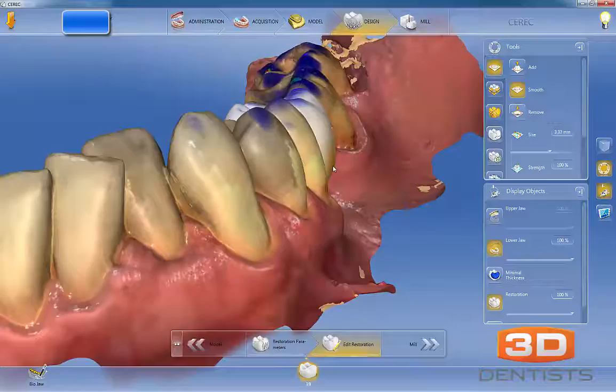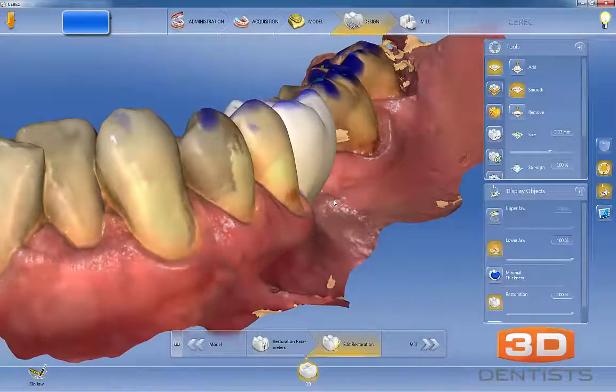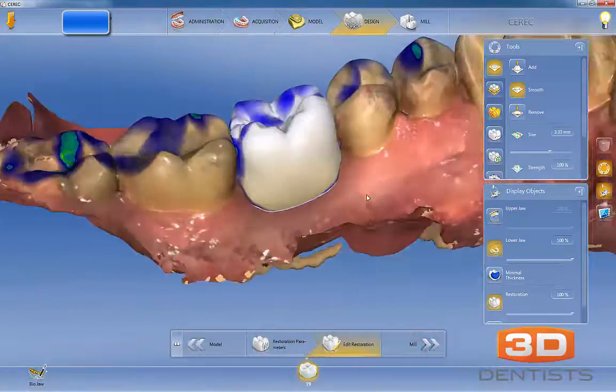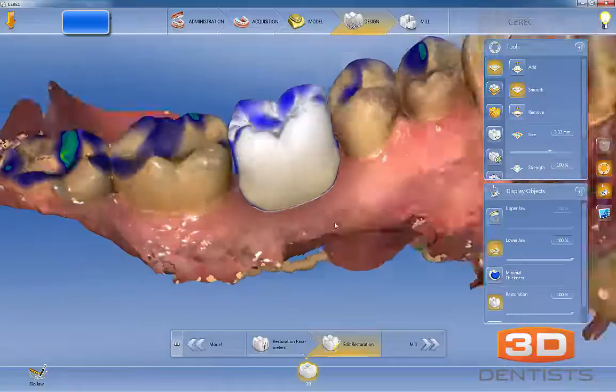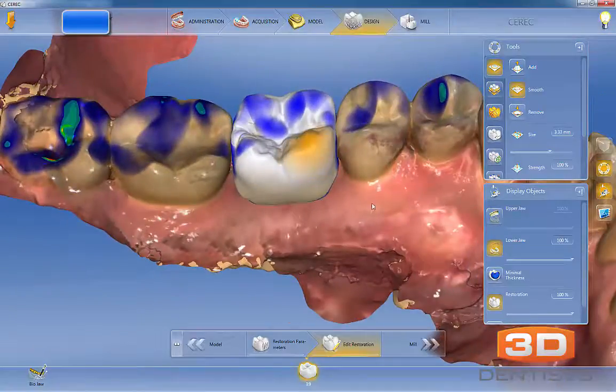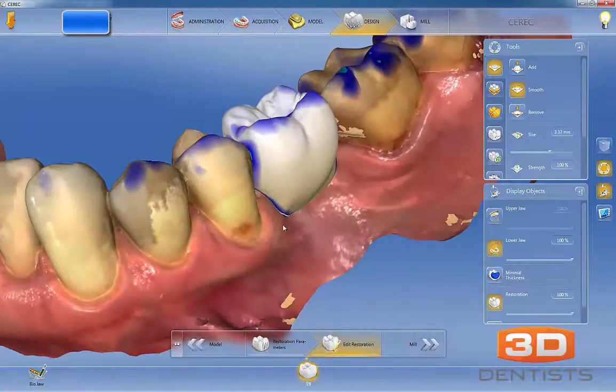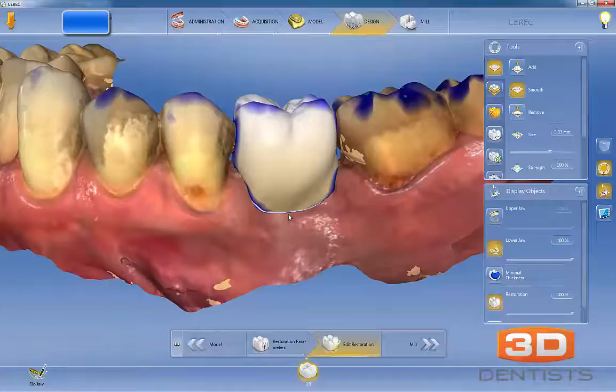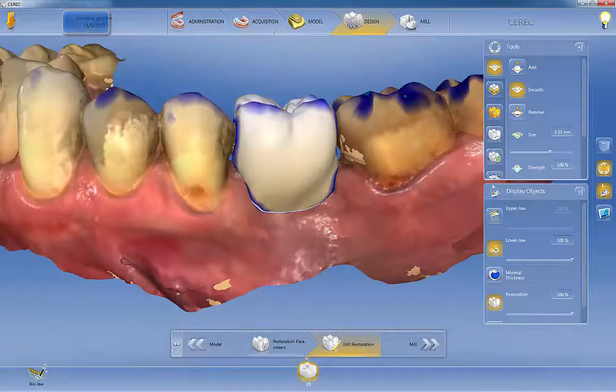And the reason we can't achieve an ideal result here right now is not because our tooth is in the wrong spot. Quite frankly, it's just that we're missing tissue there. And right here you can see our emergence looks pretty nice. So this is how I would make changes to this particular SSI file to allow us to better see where the margin is, or where the margin should ideally be, and then we can apically plan our implant from there. Hopefully this makes sense, and thank you very much.